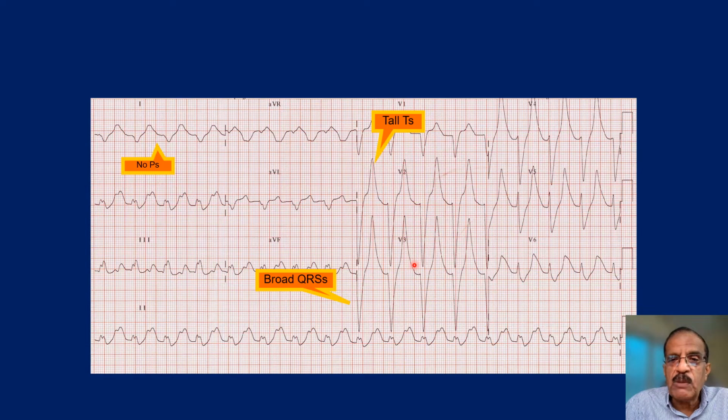This is because the P wave is actually laterally stretched. A P wave is normally a small wave. When it is laterally stretched, it becomes almost flat, so you don't see it. In this case, there is atrial depolarization, but it doesn't show on the ECG. This is sometimes called sino-ventricular rhythm. The rhythm is sinus, but you don't see atrial depolarization. It is as if the current goes directly from the SA node to the ventricles.